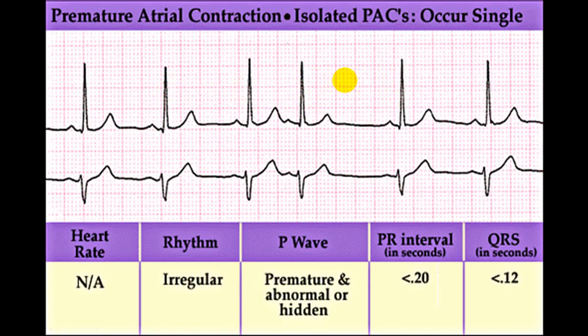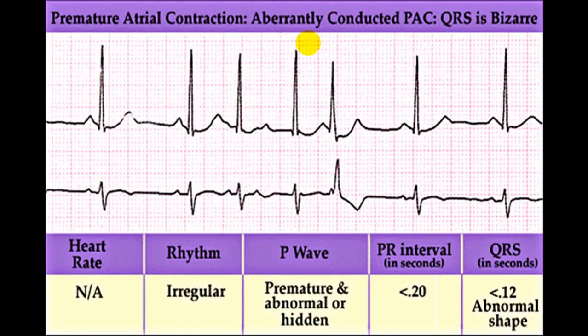And this is single. So this is occasional irregularity. Again, you can see a similar thing here, but here the P wave is followed by a QRS complex which is a little broad. This happens because when the P wave stimulates the bundle of His, while passing through it, it takes an aberrant pathway and then activates the ventricle to produce a broad QRS complex. So this is atrial premature beat with aberrant conduction. That's the reason why the QRS complex is broad.